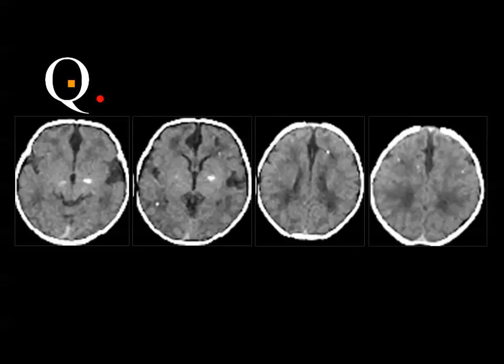The exam: axial CT scan of the brain without contrast injection. Findings: no available history. Multiple hyperdense foci scattered in both cerebral hemispheres. And do you think that this is blood? This is calcium. It's very dense for being blood, and this is calcium.